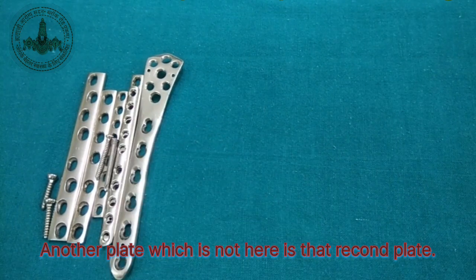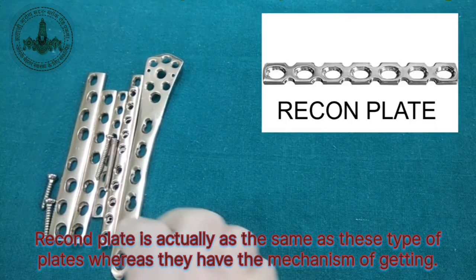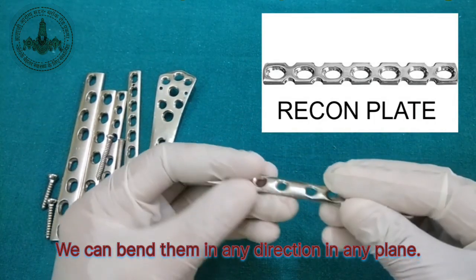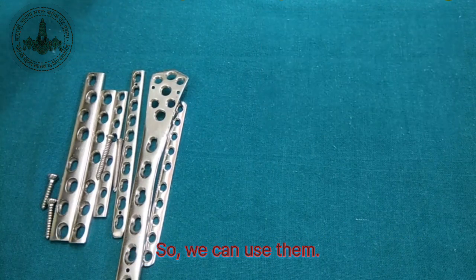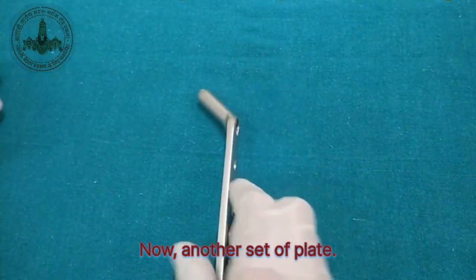Another plate which is not here is the recon plate. The recon plate is actually the same as these types of plates, whereas it has the mechanism that we can bend it in any direction, in any plane. So the recon plate is mainly used for particularly difficult anatomical regions where we want anatomical contouring of the plate, so we can use it. Now another set of plates.